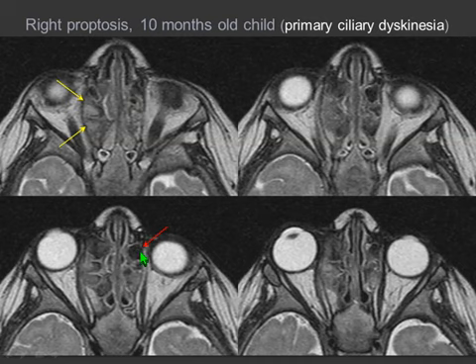hypointense signal on this sequence, even if you can see that this hypointense signal is separated from the walls of the cell by some hyperintense signal, suggesting the presence of mucosa and a content that shows very low signal. Why very low signal on a turbo spin echo T2?